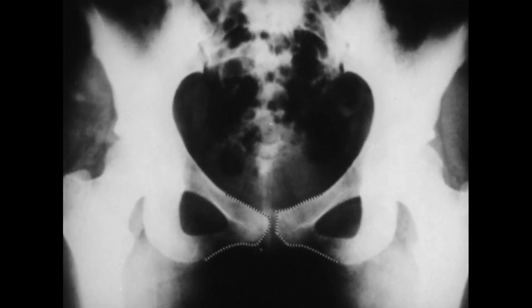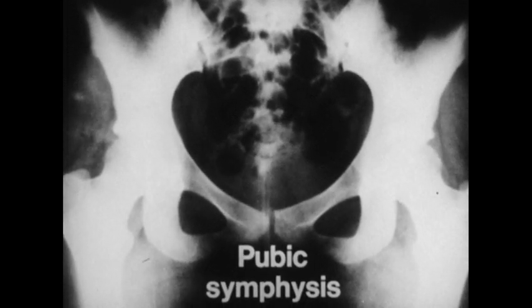Fibrocartilaginous joints include the pubic symphysis and the joints between the successive vertebral bodies.